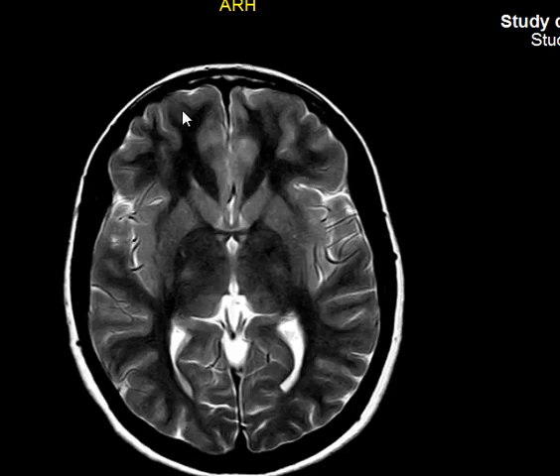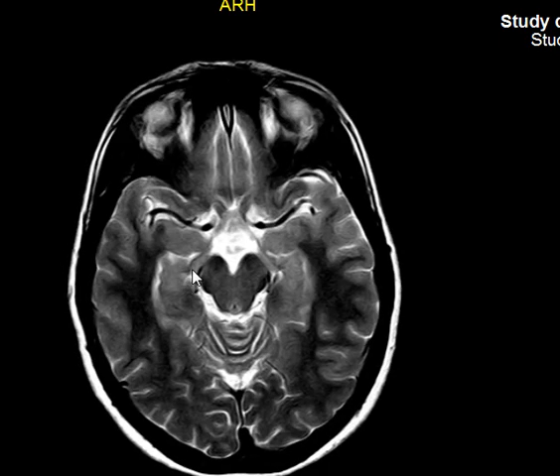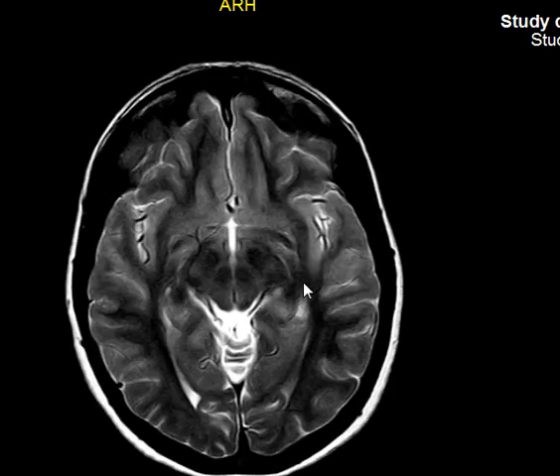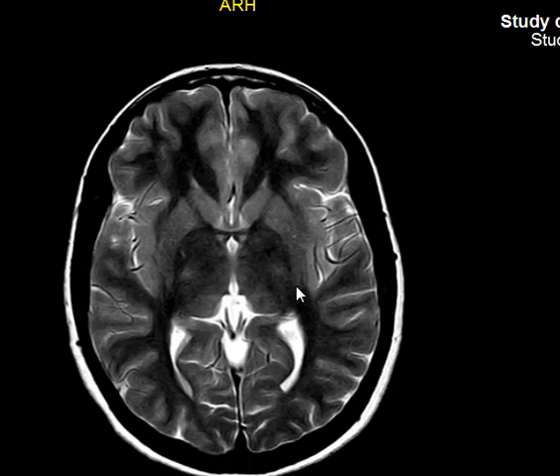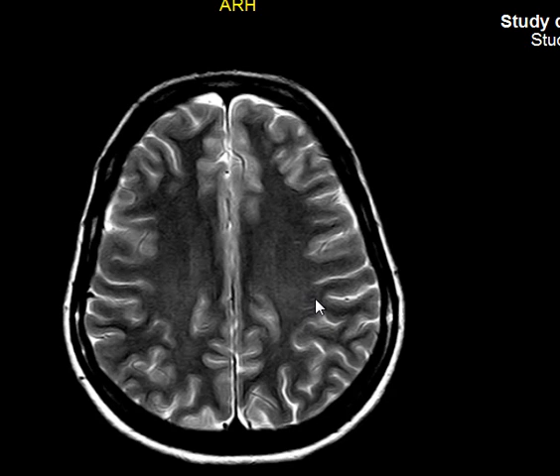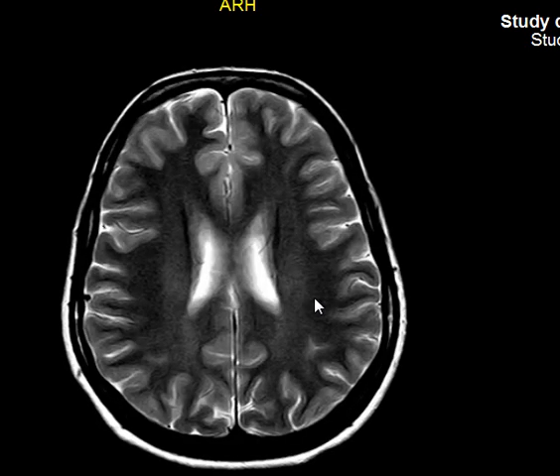Now, this is the cerebrum, the supratentorial part. Before I move to the brain stem, which is the complex part, we'll stay simple as much as possible. Within the brain, there are cavities. These cavities are filled by fluid. This fluid is called the CSF, the cerebrospinal fluid. So, let's start by reviewing the ventricles, or the cavities, of the cerebrum.